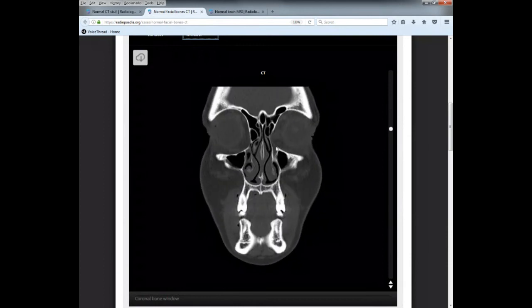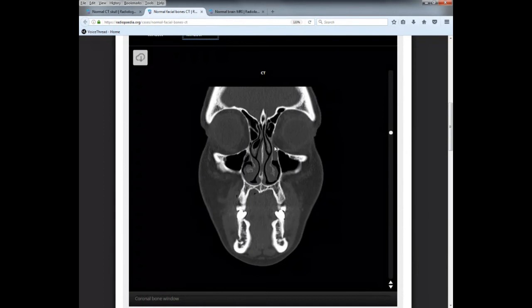Interesting, this is your nasolacrimal duct right here. That's how your tears get down into your nose, if that ever happens. That's how people have that. Some people do milk coming out of their eye. That's the weird way they can do that. Weird people.